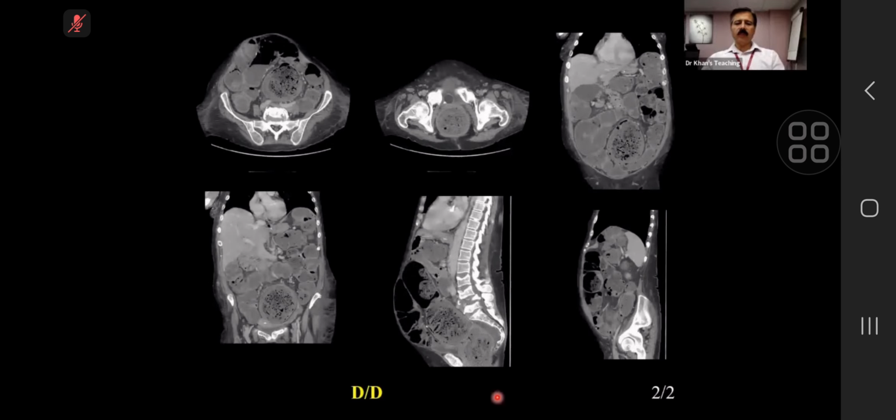Okay, so impaction in these cases, two things are very important. One is anal canal cancers. You have to ask the clinicians to have a look. That's a clinical territory, right? They can have a look. The patient might have an anal canal tumor, which is causing stenosis. So that's a potential viva scenario. Otherwise, in this particular case, there was no anal canal tumor or anything.